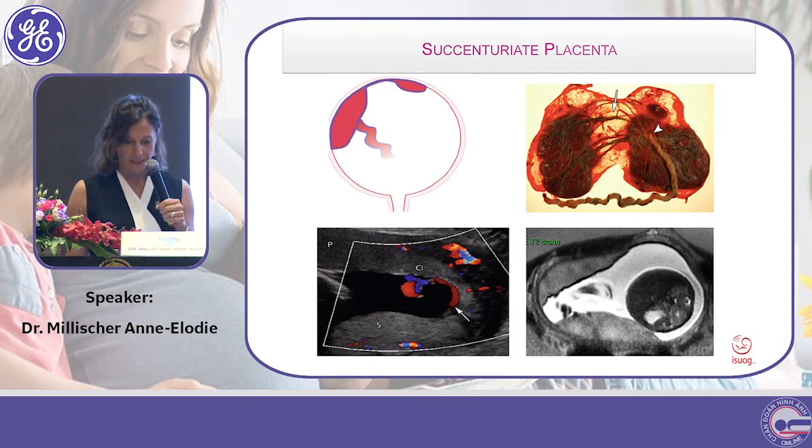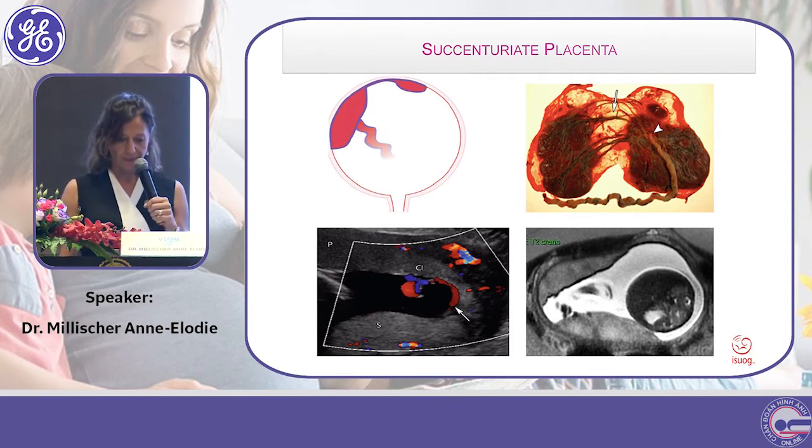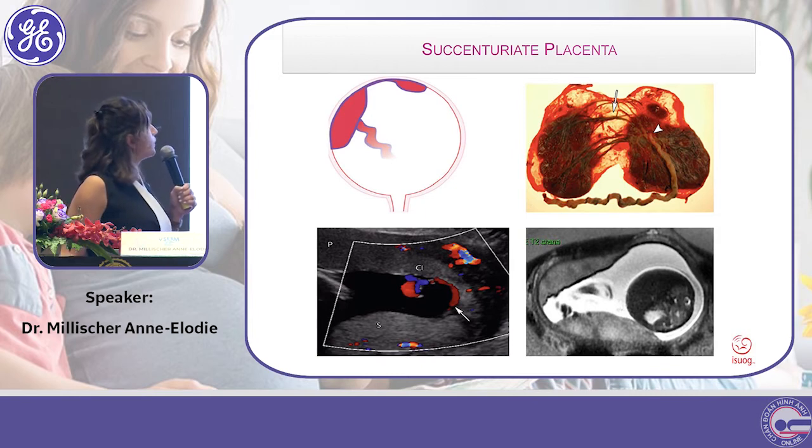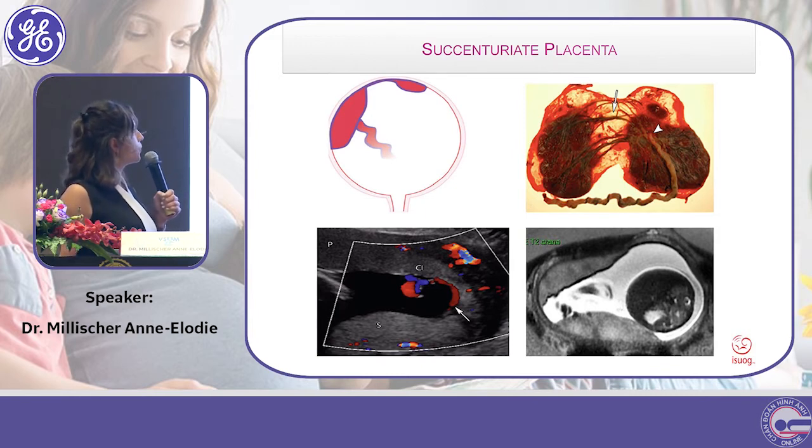Theo cái hệ thống đó, mình đầu tiên sẽ đi vào đánh giá cái hình dạng của bánh nhau và cái đặc điểm, cái biến thể đầu tiên của bánh nhau tôi muốn khảo sát đó là bánh nhau phụ. The definition of this kind of placenta is the presence of two lobes, as you can see here, with vessels going through the two parts of this placenta.